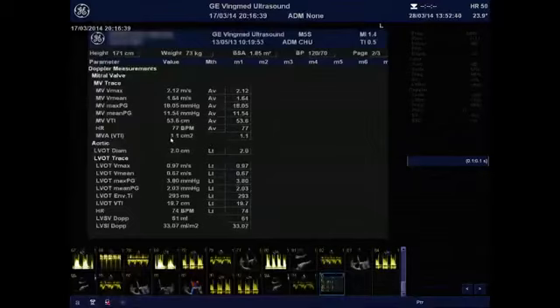To do this, you need to divide the mitral valve area that you obtain with the continuity equation by the body surface area of the patient. In that case, you will obtain an indexed effective valve area of 0.59. So you're facing a case of severe patient prosthesis mismatch.